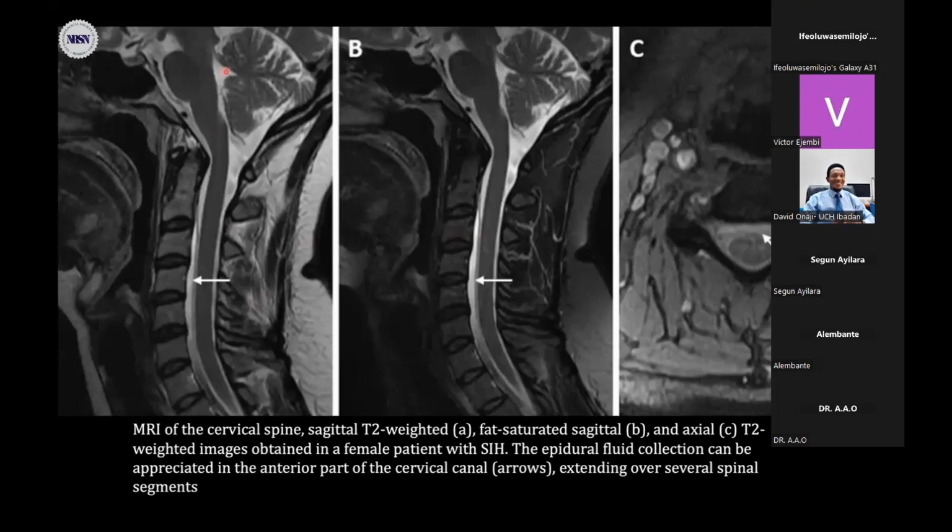So this is an MRI T2 FATSAT axial image, and this is the cord, and this thin hypointense signal here is that of the dura. Ventral to that in the epidural space, we see a CSF signal collection ventral to the cord, and we see that on this T2 weighted FATSAT image.